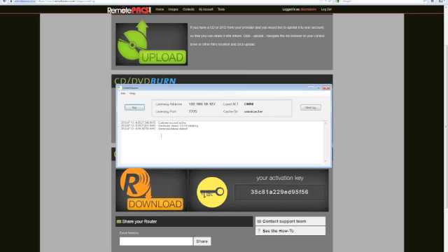So what you can do is configure your CR, your CT, your MR, whatever else you have, your ultrasound machines, to send studies to the information that's already provided right here at the top of the software. So it's generally port 7775, it's generally Omni, and whatever the local IP address is of your computer. One thing to keep in mind is that if your IP address changes day to day, then you will need to change it on the modality.